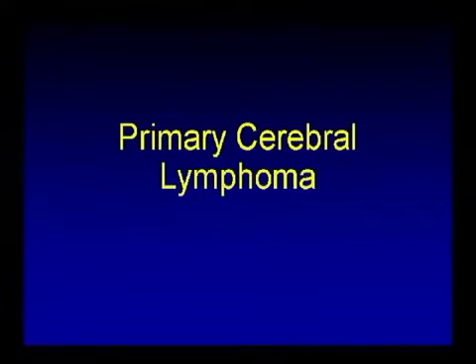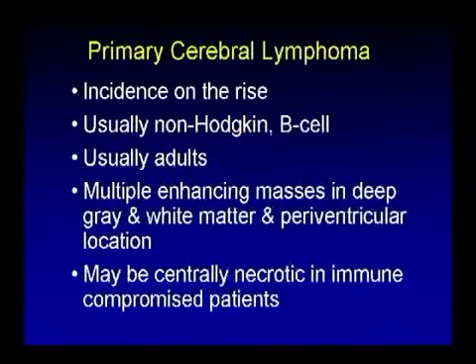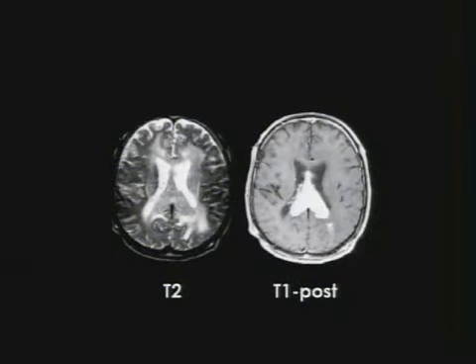Cerebral lymphoma is a very interesting tumor. Nobody can figure out why lymphoma incidence is increasing, but nonetheless, incidence of lymphoma in immunocompetent patients is slowly rising. One of the caveats about lymphoma is that it tends to involve where glioblastomas can involve. For example, corpus callosum is not an uncommon location, but usually the T2 signal characteristic can be helpful.